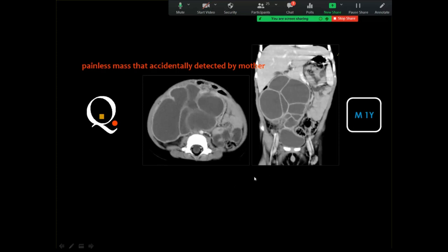And on the top of the cystic lesions in the peritoneum is the gut duplication cyst, whether it is from the stomach or the small bowel. And whenever you see that the cyst is multilocular, think of a lymphangioma. If you see some fat content, think of a dermoid cyst in the peritoneum.